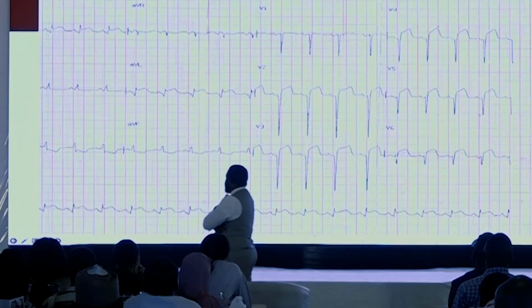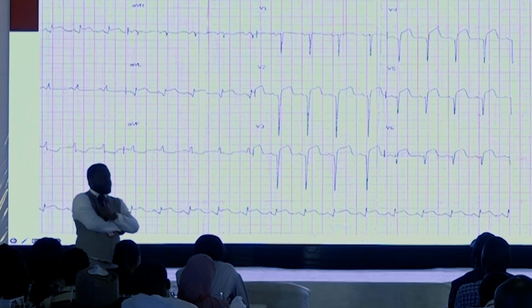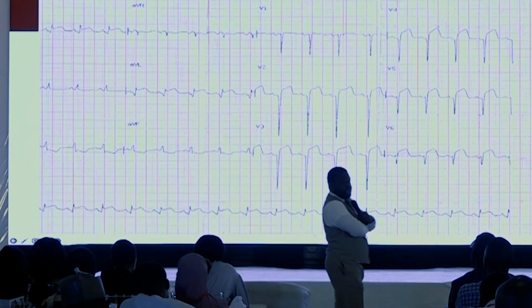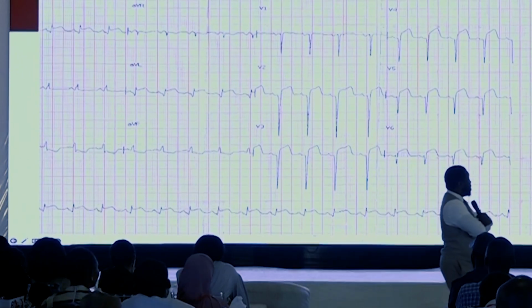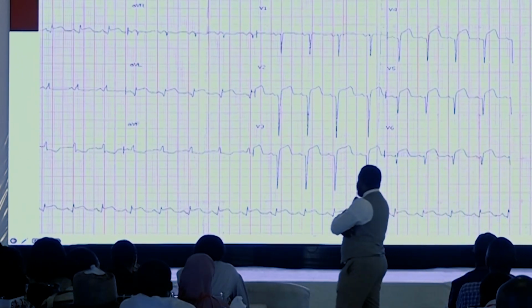Okay, can we see this ECG? This was the referring ECG. Yes, what can we say? 51-year-old referred to CardioCare with breathlessness while they are preparing for ACLS. Where's my crash cart? And where's the laryngeal mask? Yes, what can we see?